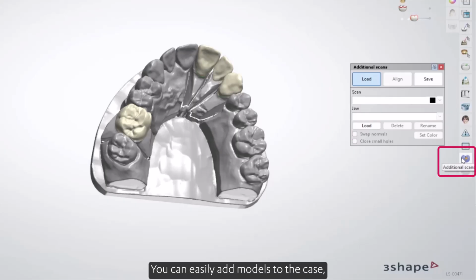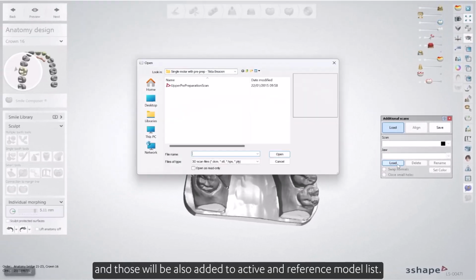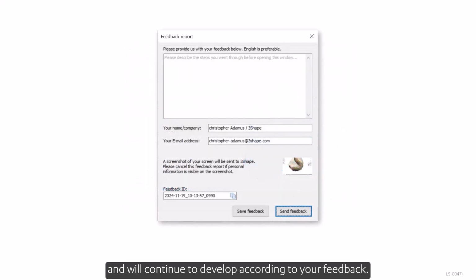You can easily add models to the case, and those will be also added to active and reference model list. This tool is being introduced in Dental System 2024 and will continue to develop according to your feedback.